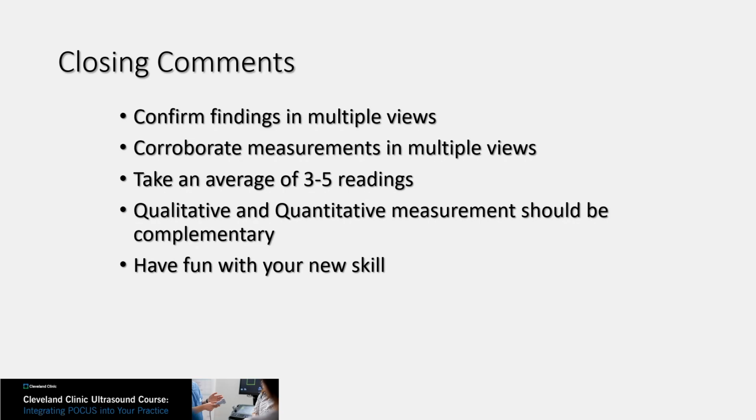So again, closing comments: confirm findings in multiple views. I always try to corroborate my measurements in multiple views just to be sure that the view is not altering the measurement. A good measurement needs a good image. Always try to take an average of 3 to 5 readings.